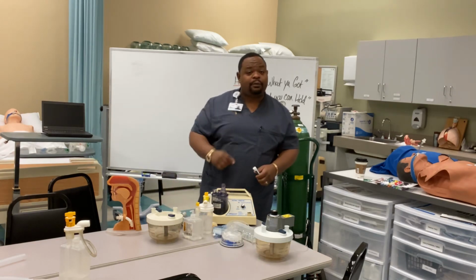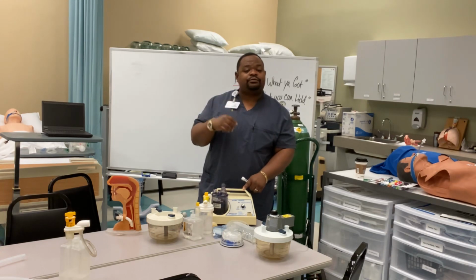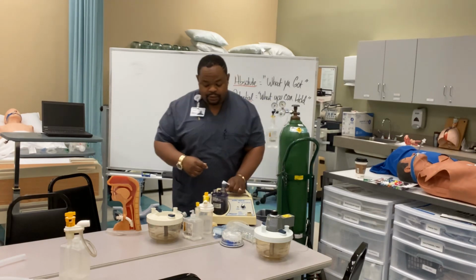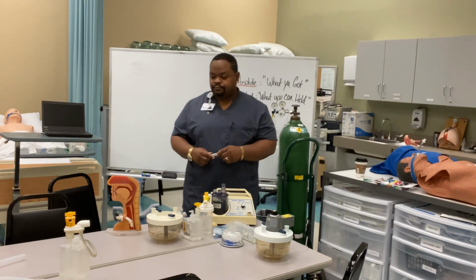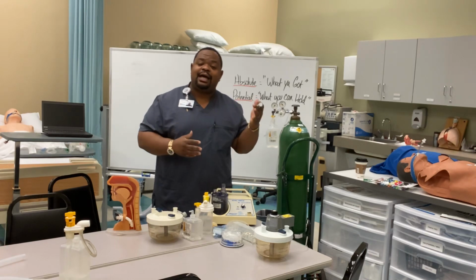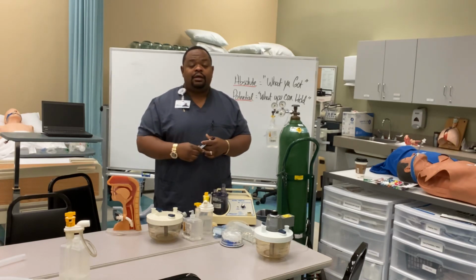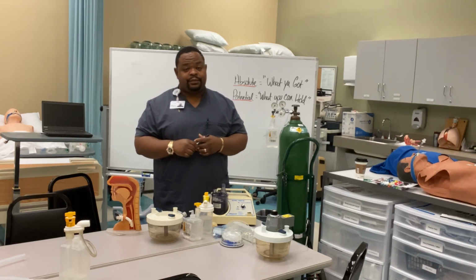And what is the magical part of it? The piezoelectric disc, or the piezoelectric crystal. All right. That, in a nutshell, is aerosol and humidity, guys. We've already done the high flow device. I showed you the large volume nebulizer. I showed you the small volume nebulizer, right?